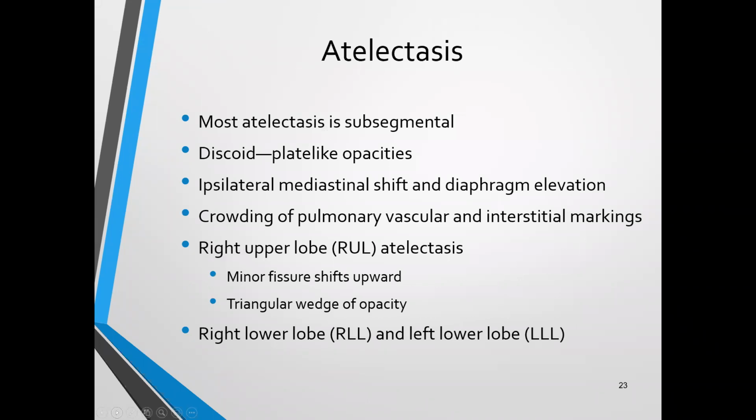Atelectasis. Most atelectasis is subsegmental, so it can be very localized. Discoid is where you can see a line, really at the base of the layer where perhaps one segment meets another. It's not the entire segment, but just a portion of it.